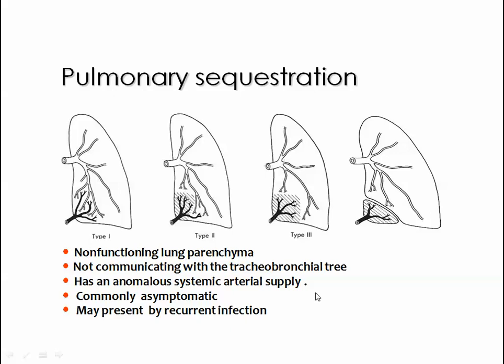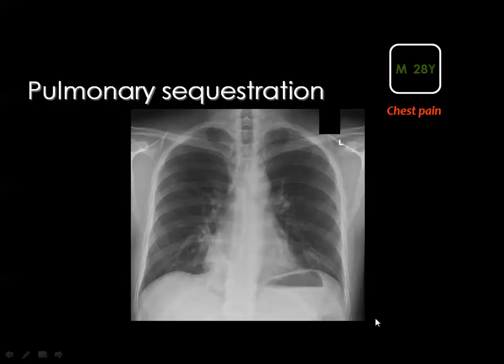And these sequestrations are commonly asymptomatic, but sometimes they may present with recurrent infection in the same site of the sequestrated lung segment.